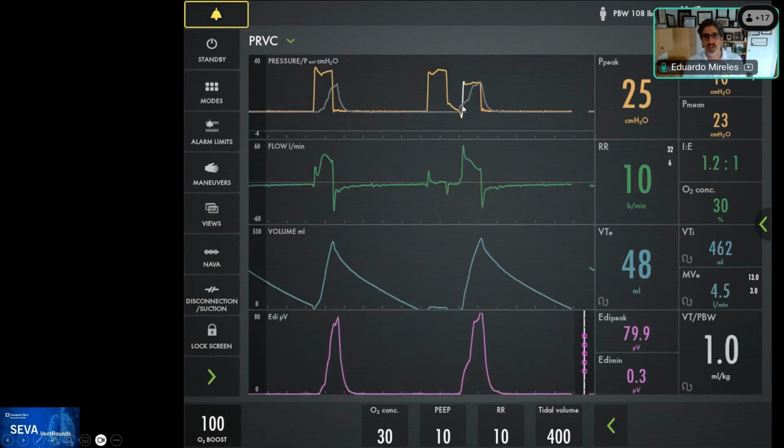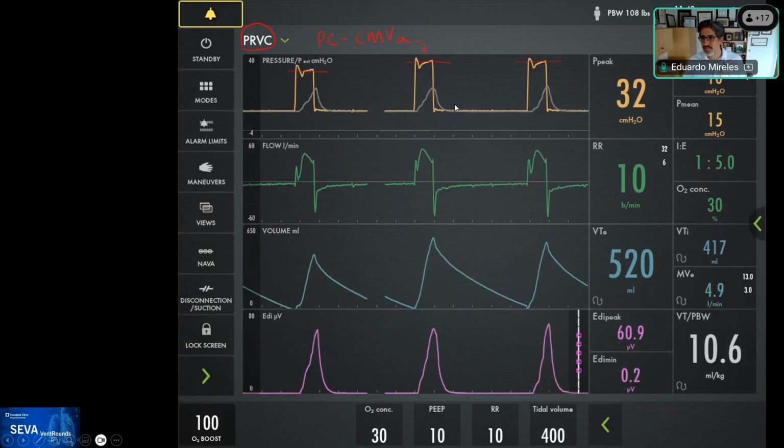So different phenotypes occurring at different times in the same tracing. Makes sense? So I see there about early cycle. Yeah, absolutely. There's going to be early cycle in some of this, but that's a result of your early trigger, without a doubt.